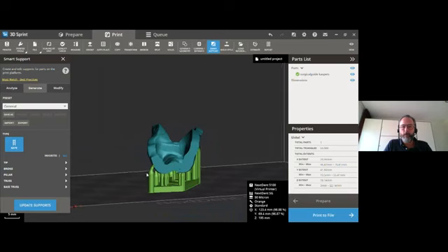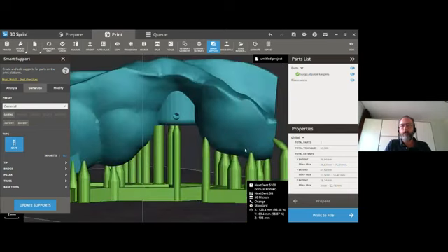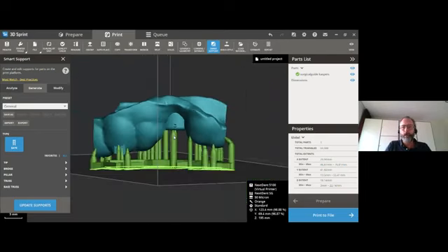And then they made a new support style with very, very thin support tips that now, if you print the part, after printing, these supports are very easy to remove, almost no support scarring. And this means that after printing, you remove the support, you wash and post-cure the part, and then you can directly send it out to the doctor.